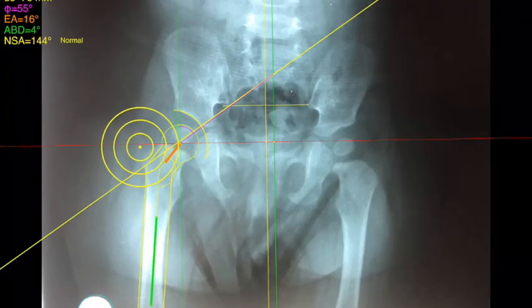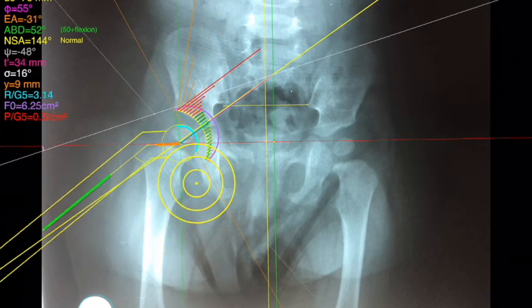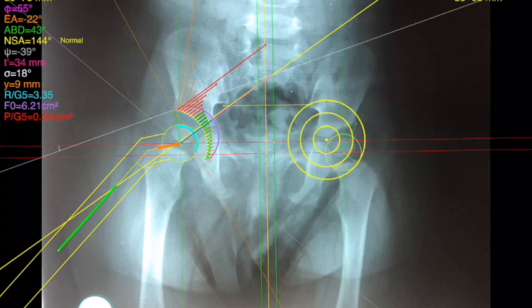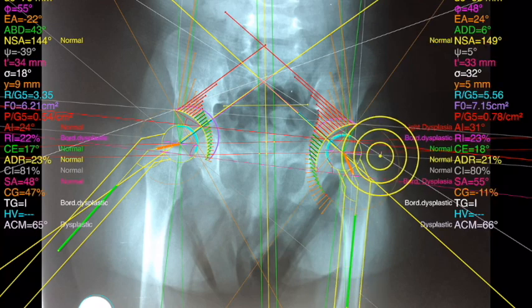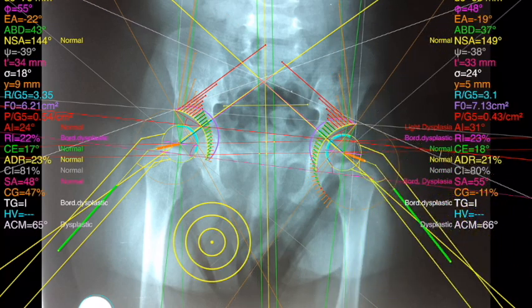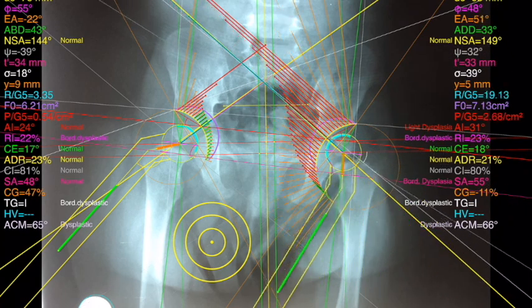greater trochanter. The powerful undo feature gives the user the freedom to make corrections without resetting the whole procedure. Simply by clicking the undo button, the measurement returns to the last chosen point or state, and you are ready to choose the same point again, without resetting the whole measurement and starting again from the beginning. Moreover, the sides are independent, thus the user can measure first any side he wants.